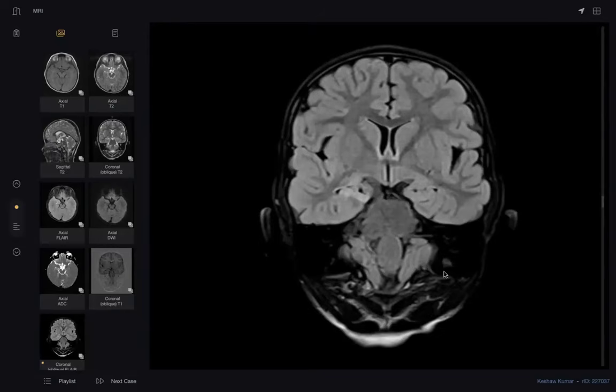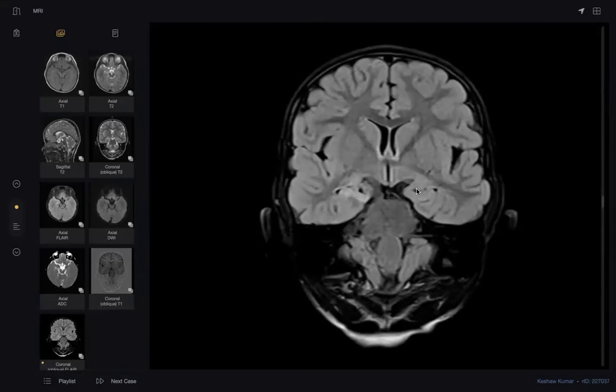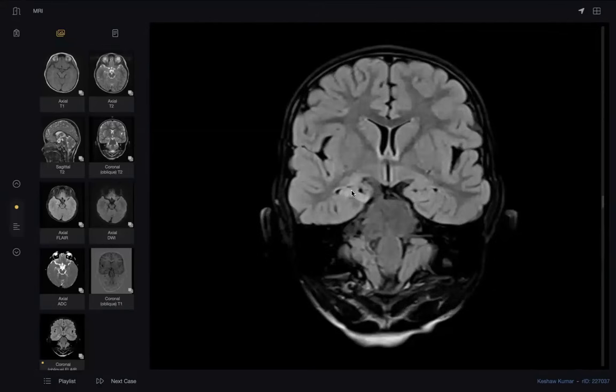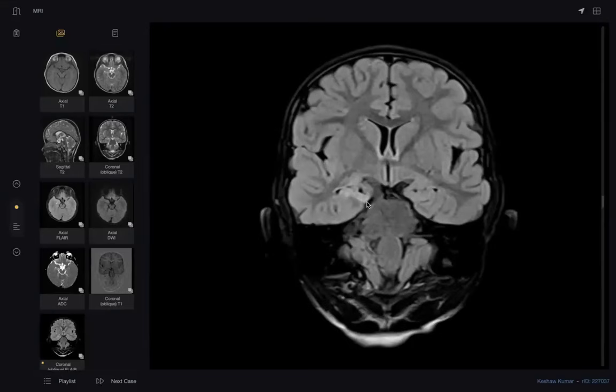What happened here? This is the exact site to diagnose mesial temporal sclerosis. When you see this mesial temporal lobe, the hippocampus, and part of the temporal horn. Why? Because when this hippocampus reduces in size, this temporal horn enlarges. See? At least you can't see an obvious temporal horn here in comparison to here. In addition to this, there is bright signal in the hippocampus. Third, reduced height or reduced volume.